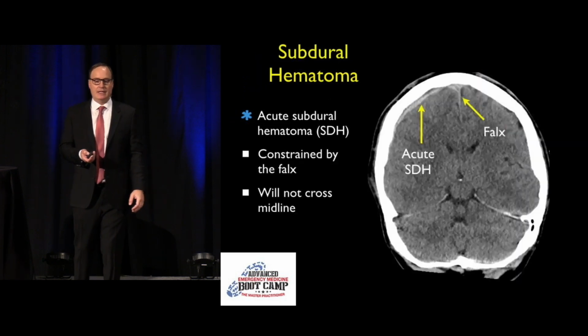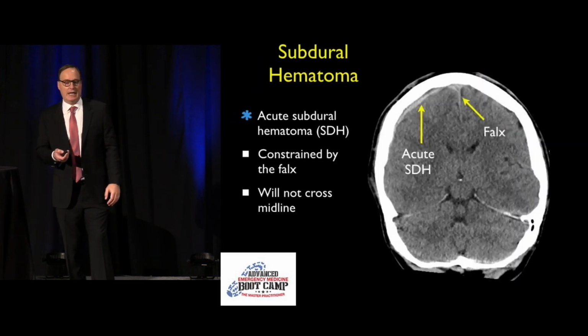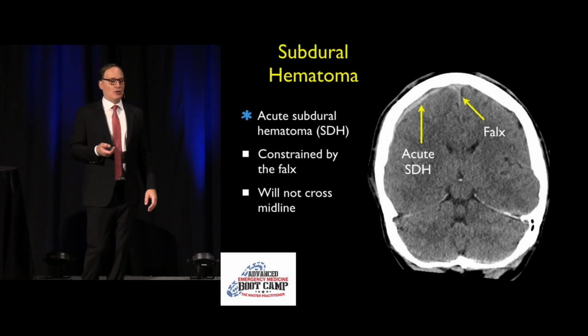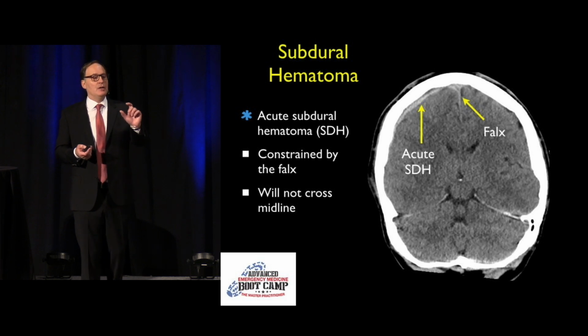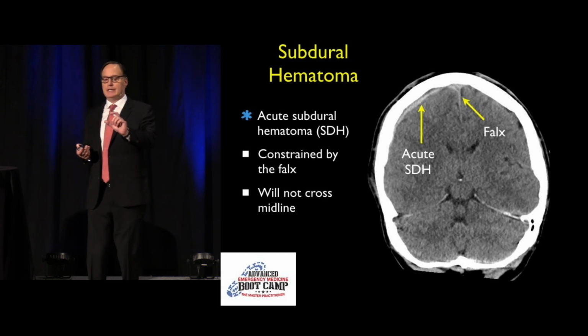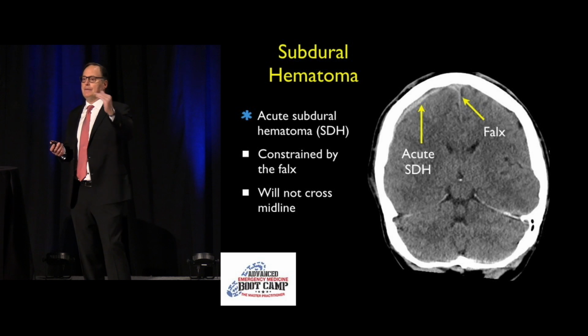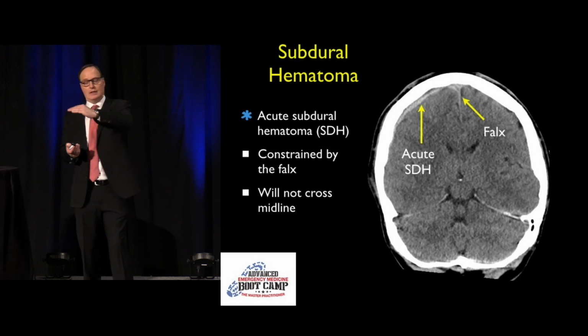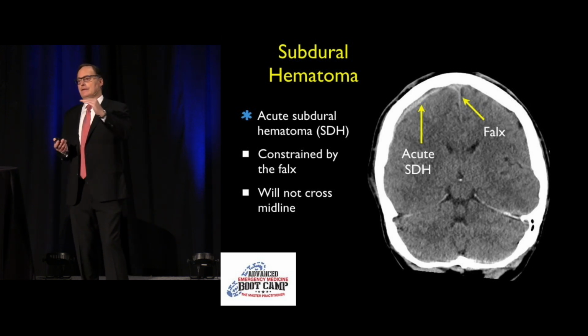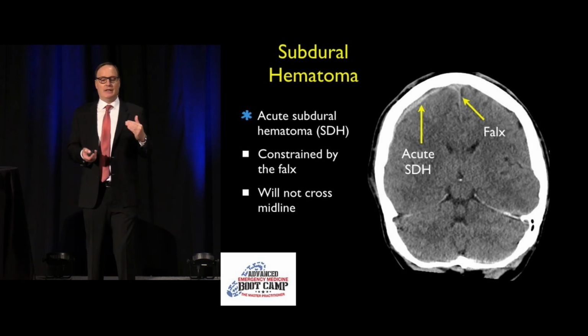Okay, so this one you can see would be important to catch. Again, here we see an early subdural, and it's very small, but notice that it's constrained by the falx. Do you guys see how it kind of layers along the falx there? Because it's underneath the falx. And that's the difference between a subdural and an epidural. An epidural will actually cross along the midline and can cross the falx. It's on top of it, whereas a subdural is going to be under it and will be constrained by the falx.